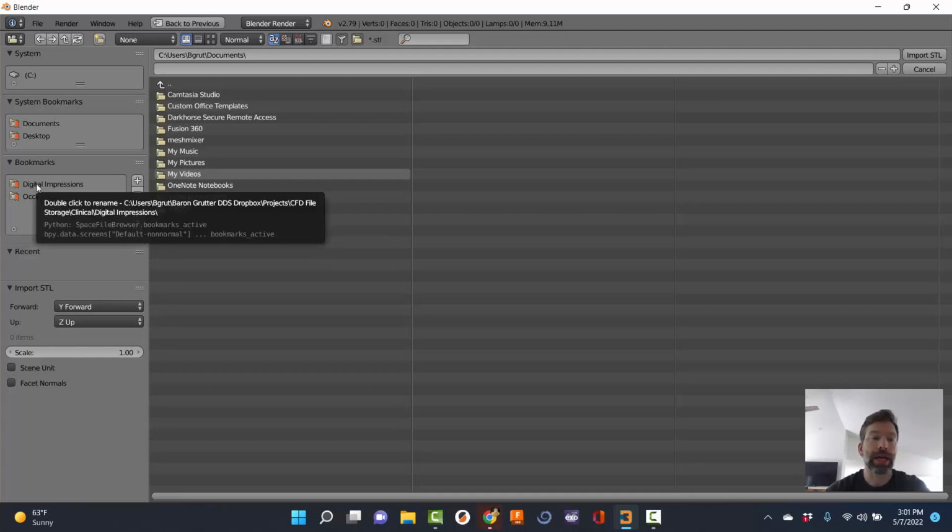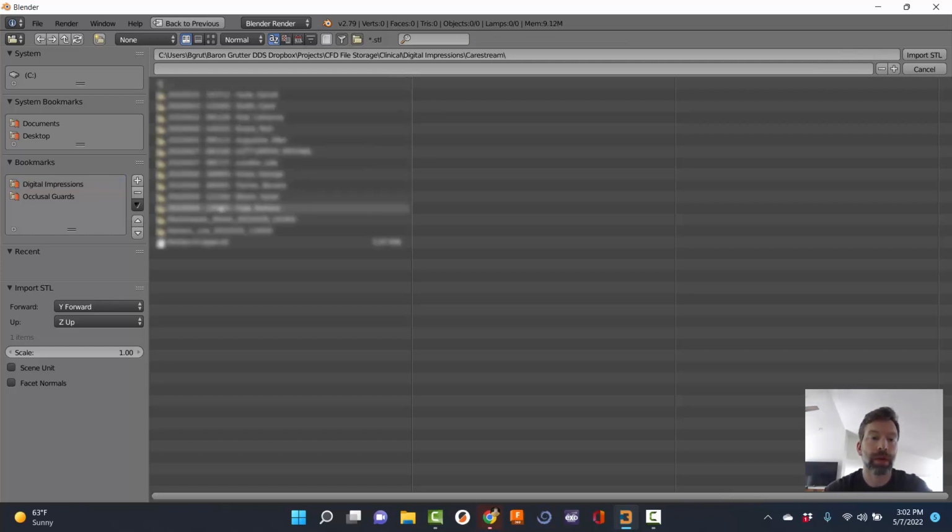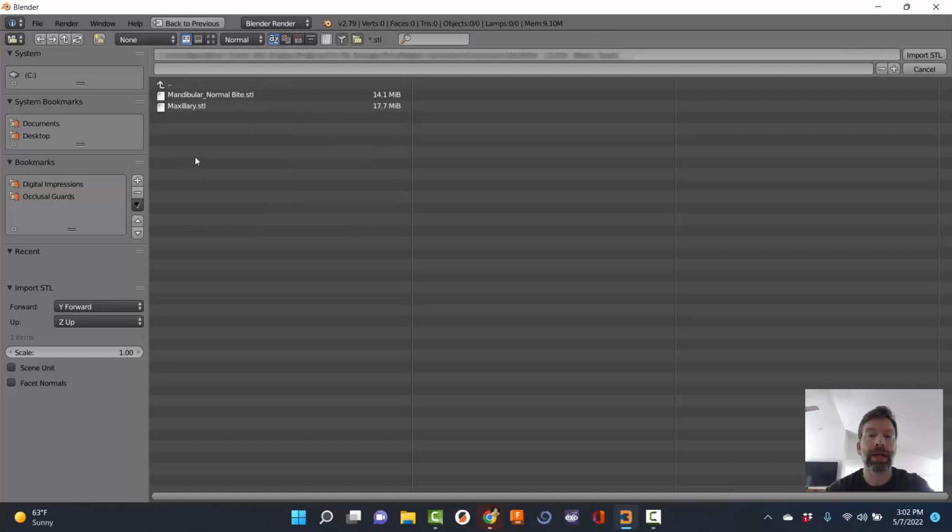All right, so let's go ahead and click on this, and this is where it might get grayed out. All right, sorry, digital impressions, Carestream. I need to add one for my Omnicam scanner because I just recently got that networked to upload. That's why I have a folder specifically for that. Okay, so I'm now in this patient's folder. I'm going to select both the models by holding the shift button. It's backwards.